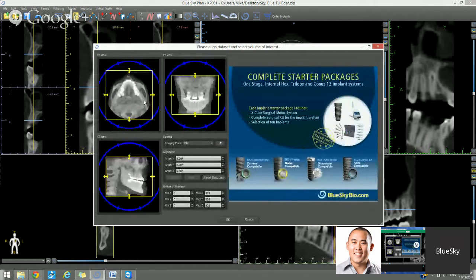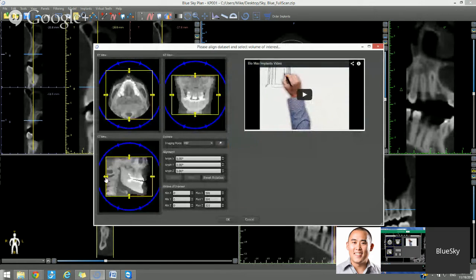Now, the next step before we finish loading them is we're able to define the field of view. You could grab any of the margins or borders and drag them inwards to define the field of view. The reason that's done is twofold. First of all, you want to maximize the relevant field of view in the different views, so you don't want extra parts of the patient that aren't necessary showing up there. Also, it loads less data, which makes the case smaller and easier for your computer to process, save, transfer, and store. So there's really no need to load any extra information.